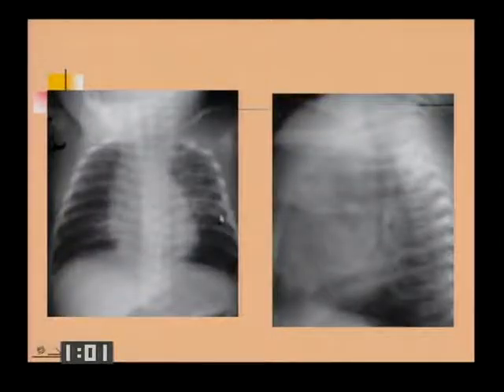If the child has chlamydia, you just get this multiple areas of vaguely increased density. The heart borders in this child are indistinct. Perhaps there's nothing specific about it. Maybe it looks much like what the textbooks used to call pertussis, but it's the age, the accompanying symptoms, and the radiographic picture that take you to the final diagnosis.